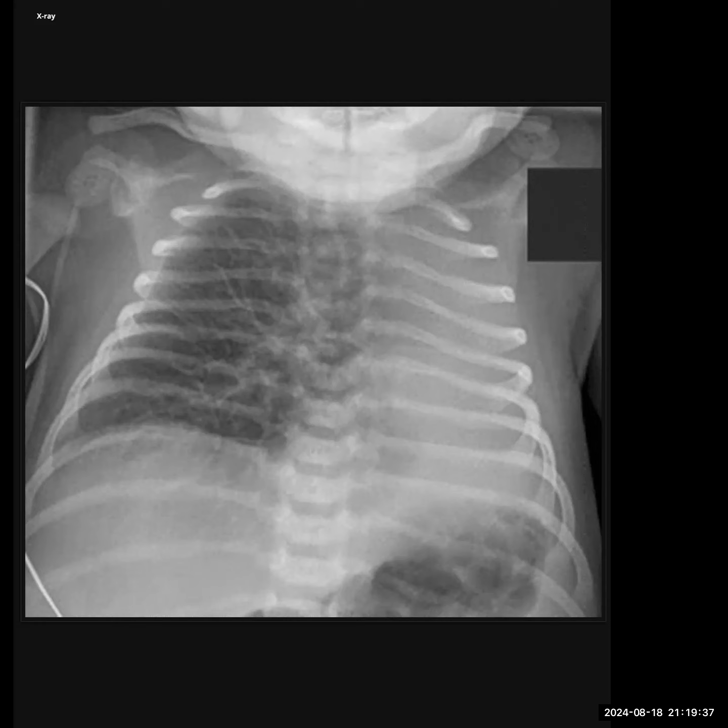Or any external compression can cause this, like any tumor in the mediastinum, like neuroblastoma. I can't see any obvious calcification in the thoracic region. In my routine practice, I would also correlate with orthogonal views to look for any mediastinal mass. I would convey these findings immediately to the referring clinician because this patient needs respiratory assistance with an endotracheal tube.